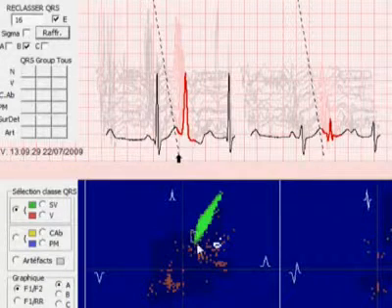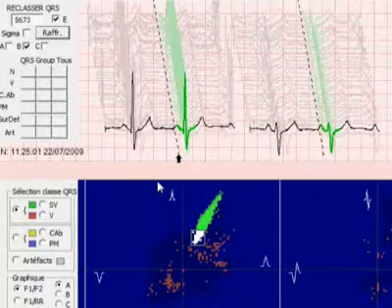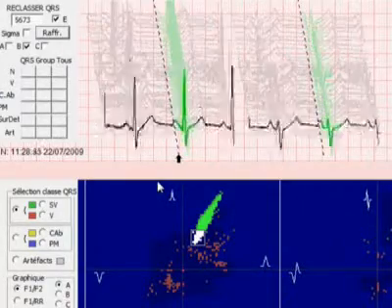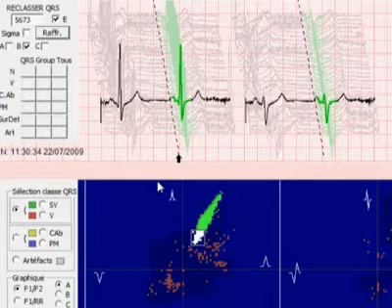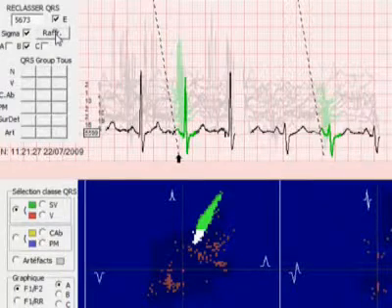This method has 2 major advantages. You can reclassify thousands of similar QRS by clicking the QRS column button. You may detect abnormal shapes that are hidden in the batch. Without autocorrelation, you may have to review and check large numbers of pages.